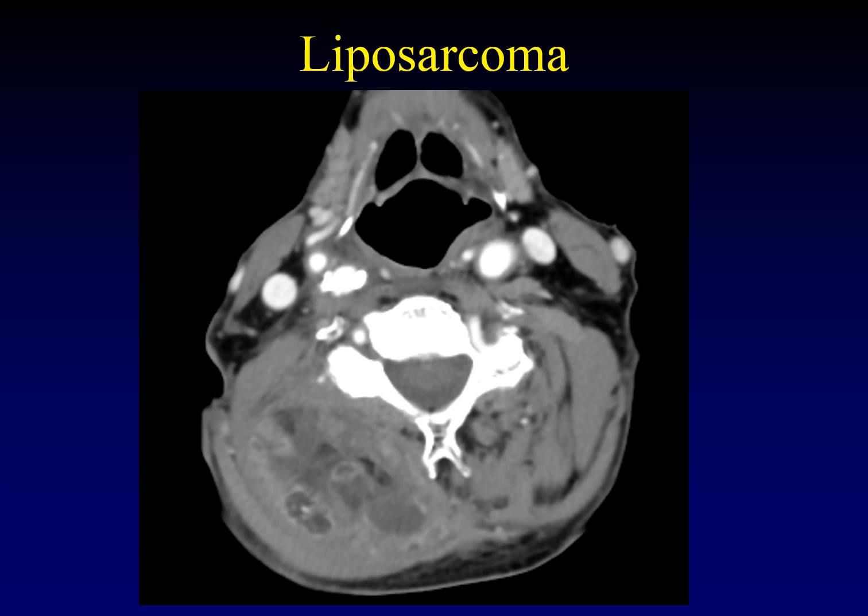Of course, liposarcomas appear on a spectrum from extremely dedifferentiated lesions that you only know are liposarcomas when you do a genetic analysis, all the way to things that look essentially like lipomas. You can barely make out any sarcomatous elements, and they grow at a negligible pace. Most liposarcomas are in this end of the spectrum where they really look like sarcomas with just a couple of fatty elements.